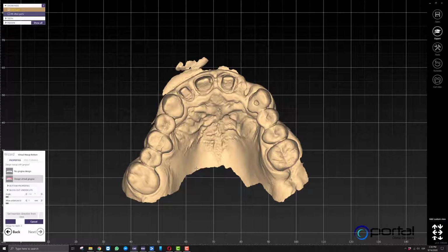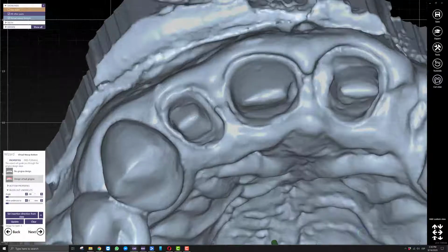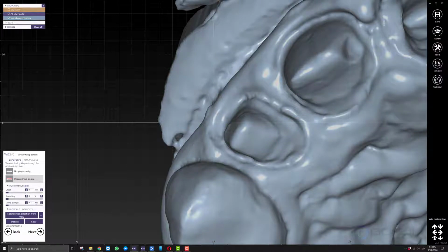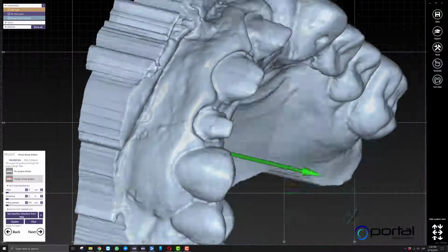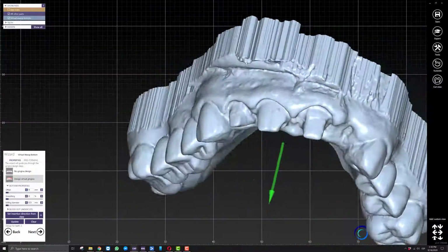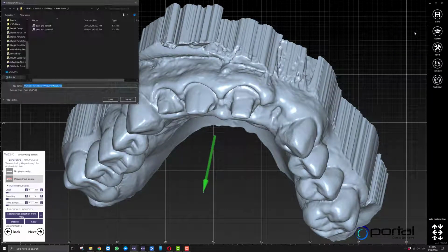So this is one of the methods that can be utilized. I think it's technically the same process that you follow on Mesh Mixer. When you try to mesh two things together, the software just creates a new mesh that covers the same surface. And so, for example, now I can utilize this as my model. So I lose a tiny bit of accuracy, but this is one method we can utilize. And so then what I would do is I would save this STL that I'm visualizing right now, this mesh, and call it, I don't know, new model.